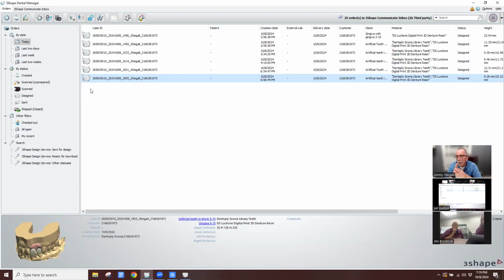It'd be too difficult. It'd be great if 3D printing could figure out, and maybe the jetted technology will figure this out, that we'll put our attachment on this little holder thing and the denture will print all around it. That would be pretty awesome. But right now, what we have to do is just plan ahead and prepare for it. So I'll show you my simple workflow, right? So if I've got a model with locators on it, or if the dentist took a scan in the mouth of locator abutments.